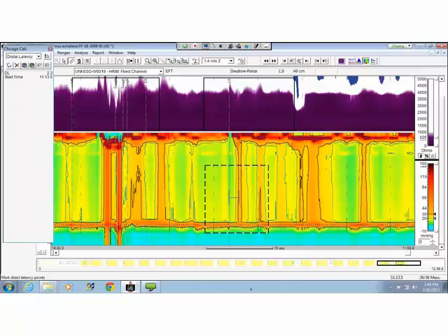The CDP should definitely be less than 5 centimeters up from the LES, usually closer to 2 or 3 centimeters from the LES. But does it really matter because the slope is the same all the way down? Less than 4.5 seconds is an abnormal distal latency. And I would log it.